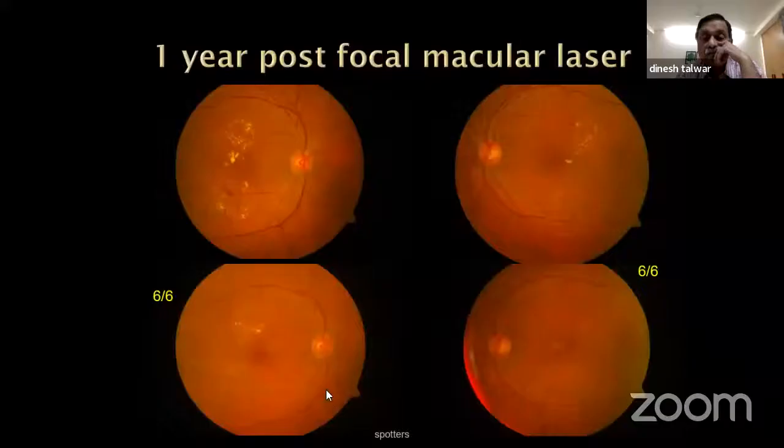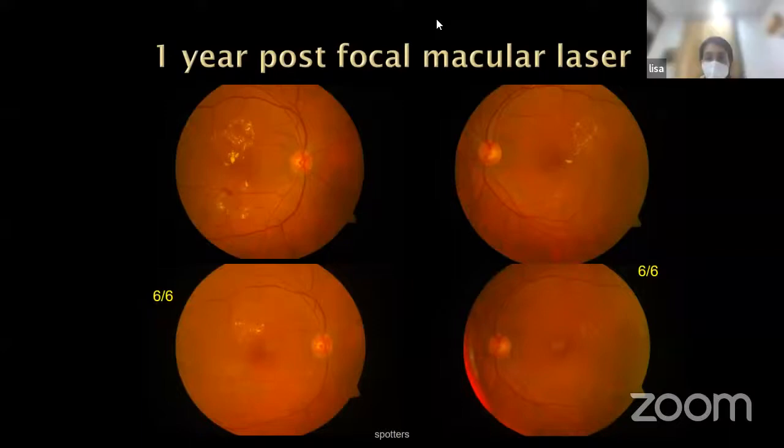Okay, so now go ahead, Gopal. So what happened? Incidentally, the same particular thing is there in the other eye of the patient also. You can see where the laser was done, the edema has gone away. Even though on the left side the microaneurysm is still there, most of the edema has gone away.